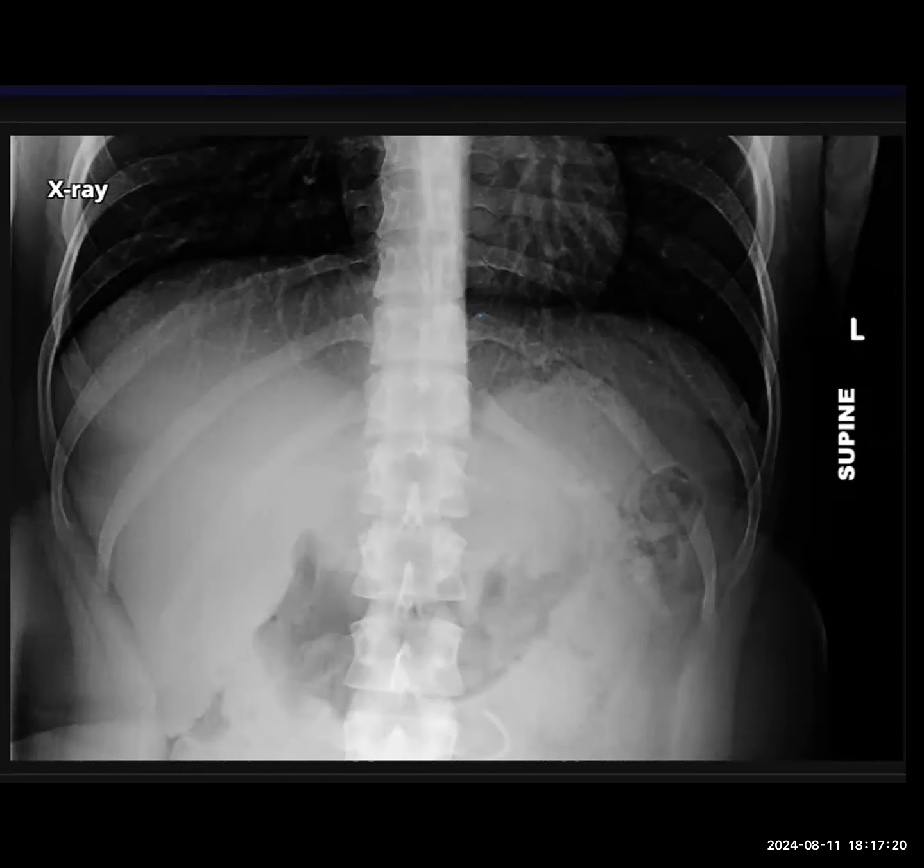This patient had a recent renal procedure done, and now the patient complains of hematuria. So in a case of recent renal intervention, this could be emphysematous pyelonephritis with pneumoretroperitoneum. Anything else that you have seen? Anything else that you think you might have missed? Can you look at the corners of the screen of the film?